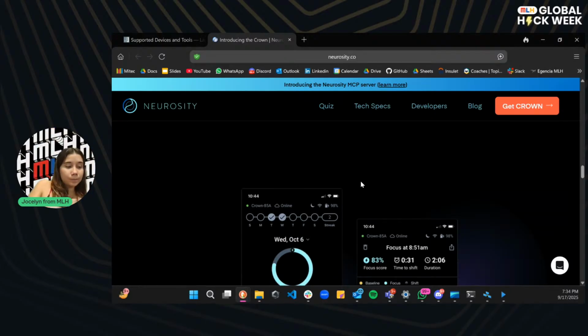Right now, I do not have it connected in here. Let me plug it into my Wi-Fi. So I have to turn on my Bluetooth and then pair it up. Bluetooth is connected. Awesome. And then let's connect to Wi-Fi.